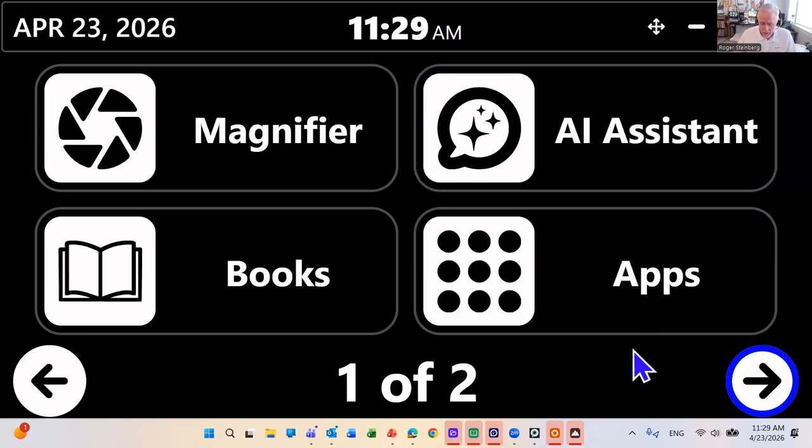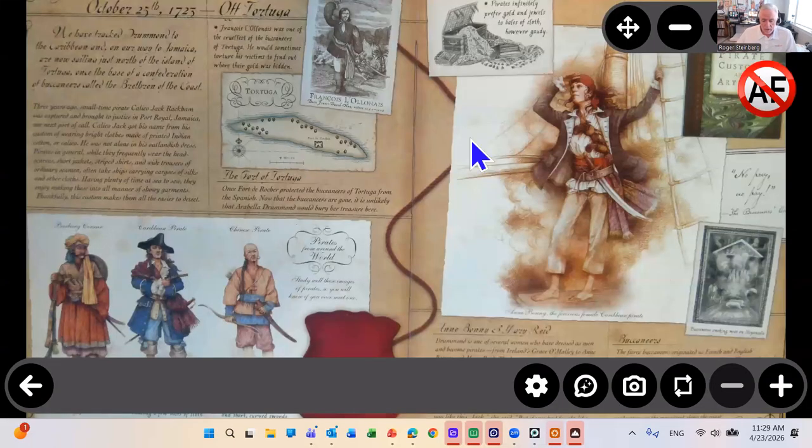I'm going to quickly highlight a couple of these for you. So here I've turned on my magnifier, and you can see that it is turned on. And in the upper right, there's those Windows controls. And this is where I wanted to point out, this is why we did them the way that we did, with just a background behind them and just in the upper right corners, because if we were to have a header across this entire page right now, it would take up a lot of the screen real estate where you're visualizing the page that you're working on.